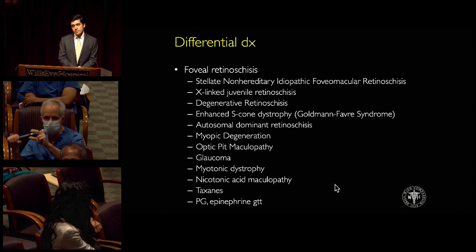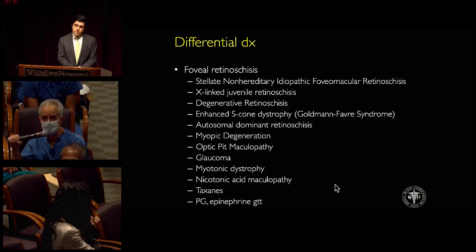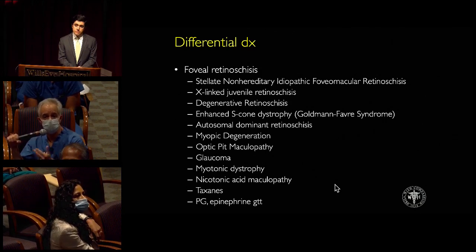When the cystic change is thick and relatively diffuse or broad, then you start to think about some of these non-leaking exudative processes. But a fluorescein angiogram would obviously help you differentiate the two, short of any other associated features. As you can see in this list here, you're assuming it's a schisis, and it probably is, and virtually everything on that list, except for the bottom one, would not be expected to leak on a fluorescein angiogram.